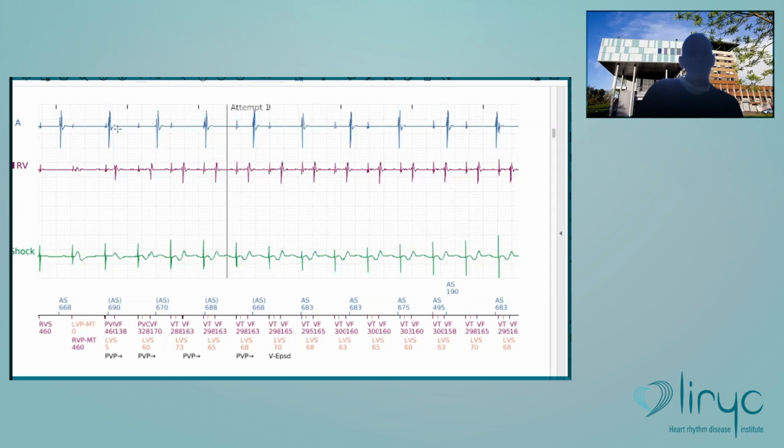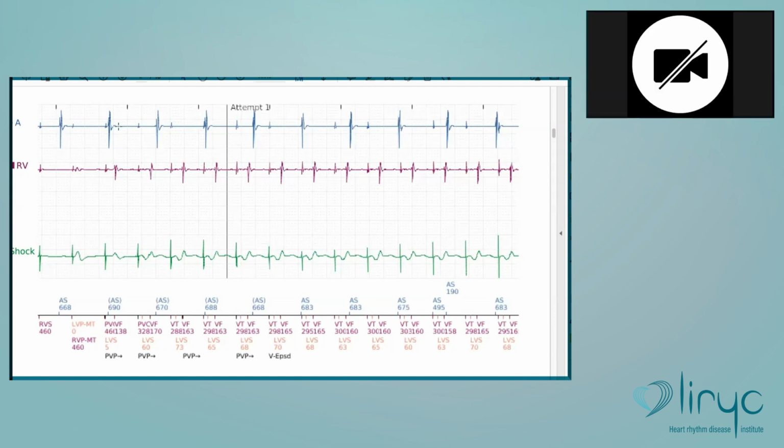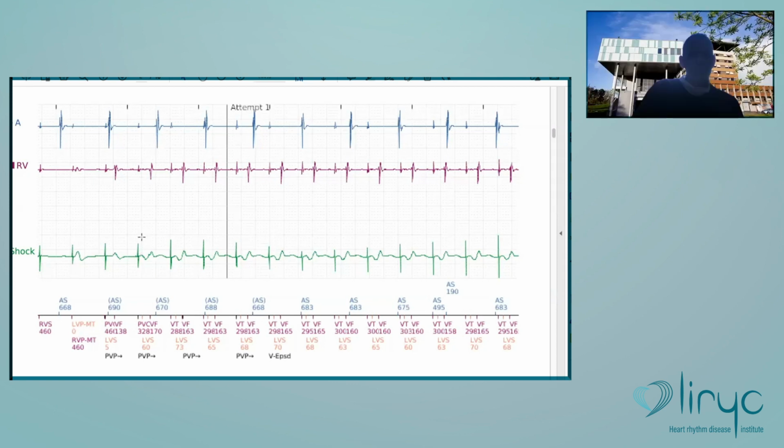On this one, you could have a doubt. You see this signal here, and you could say maybe this one is oversensed. But if you look at the next cycle, you see there is a first signal and a second. So on the right ventricular channel, it's quite organized: 1, 2, 1, 2, 1, 2. You see, these intervals are fixed, and these also are fixed, with an alternance between two morphologies. So one of the possibilities would be T-wave oversensing.